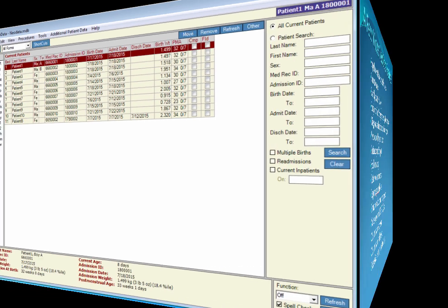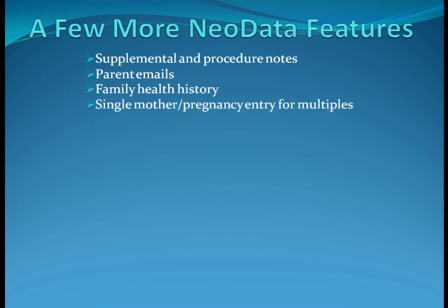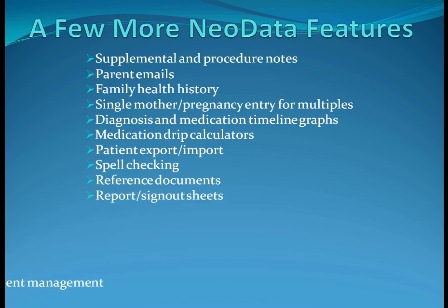You have seen the main features of NeoData, but there are many more tools within the product that help with the documentation of the NICU patient and management of the NICU itself.